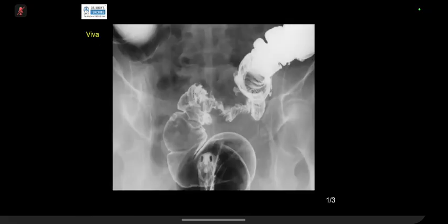This is diverticulitis. So of course, diverticulitis CT, I think, is the most common and important CT. I'm not going to concentrate too much on that because of time factor. But I think in UK, one of the most common conditions which we see with acute presentation is diverticulitis. And the spectrum in Crohn's disease, for example, is very unique because of so many complications. Diverticulitis, I think, beats Crohn's in its presentations.